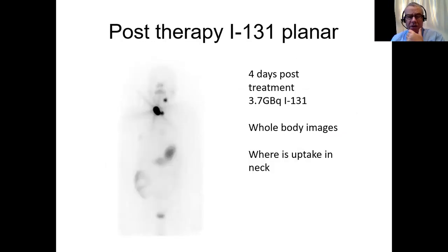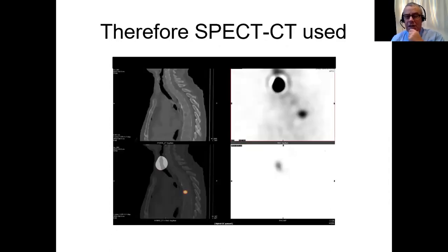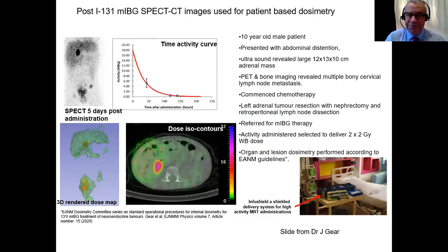The whole body confirms that it looks fairly good, with majority of the disease on the right side, as we saw in the SPECT study. Fortunately, we didn't leave it at that, and we did this sort of high gain study, because we weren't entirely convinced that we had not missed anything. And in this fairly early stage disease, we found in the thoracic spine small area focal uptake, which corresponded to a lytic metastasis. So this patient went from a stage 1 disease to stage 4.